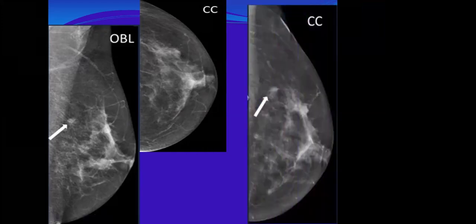So I can do, roll it. Yes, I can do extended lateral. You see, this is a CC view. We said before, the extended lateral is the CC view.